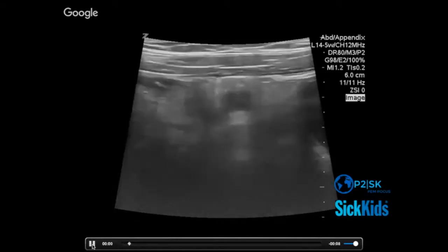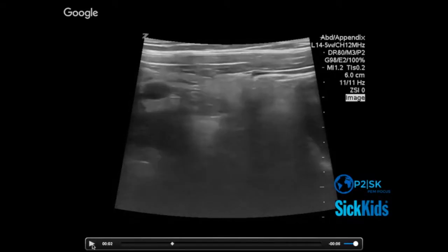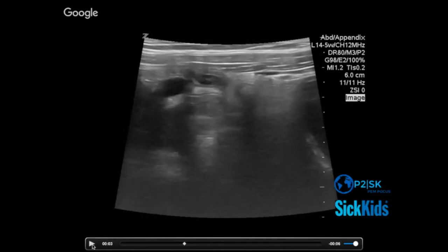It's interesting, this one is probably, from a measurement standpoint, may not meet criteria in other respects. And an example of, so here's the appendix in what is probably a normal state. So there's people with, I don't think any definitive evidence, but it kind of makes sense holistically that an appendicolith may lead to appendicitis by causing local wall pressure and necrosis and allowing bacteria to access the submucosal layers.